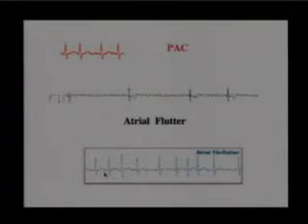Now this particular patient is having a fairly rapid ventricular response to the atrial fibrillation, but notice that the ventricular beat is itself irregular. See, they are not the same intervals apart, and it's a fairly rapid, irregular ventricular beat. Now, is atrial fibrillation immediately life-threatening? No. As long as the ventricles are beating, you've got cardiac output, and blood is getting out to the rest of the body.